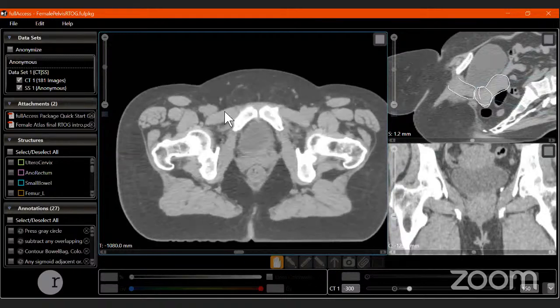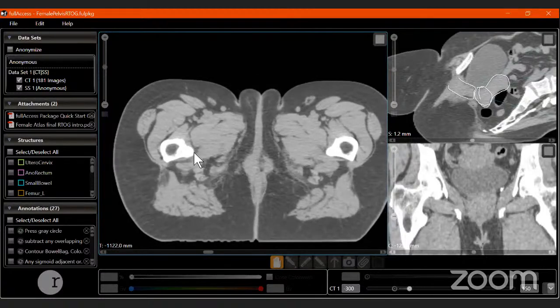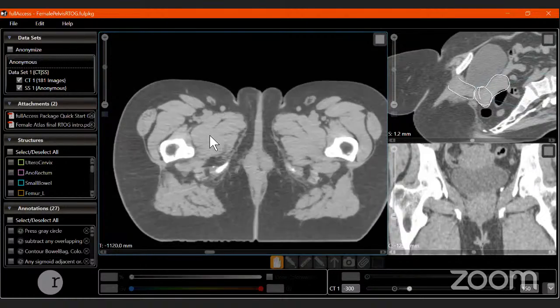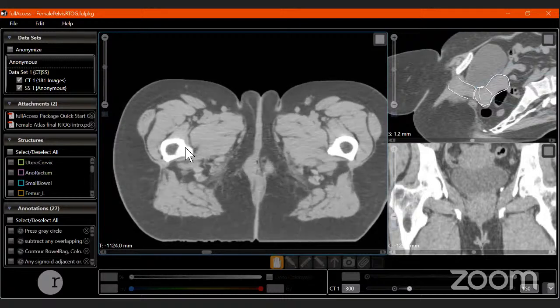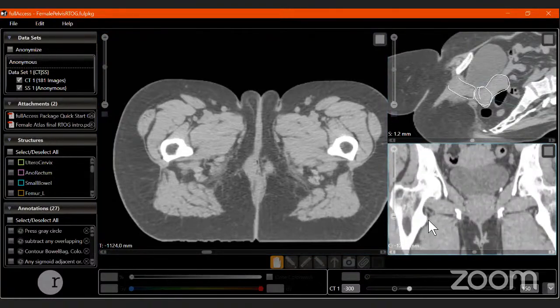So we stop here. As for the lower extent, below the neck of the femur, as you come down, you see there is one projection. This outward projection is the lesser trochanter. At this place, we stop contouring the inguinals. This is the easiest way of identifying it. If you can't identify this emerging poking structure in the axial scan, go and check it in the coronal scan. It's quite obvious.